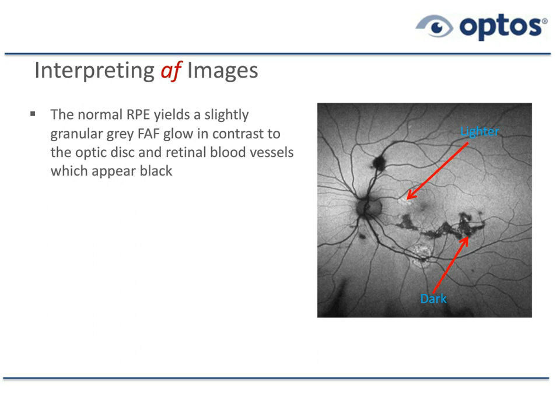I'm looking now, and you can't see my pointer, but let's say in between those two red pointers going out in this left eye temporally, sort of the typical gray that we see. In addition to that, certain areas can be lighter. That's shown with an arrow. So that would be an area of hyperautofluorescence, and below with a second red arrow, we can see zones which are dark, which means hypoautofluorescence.